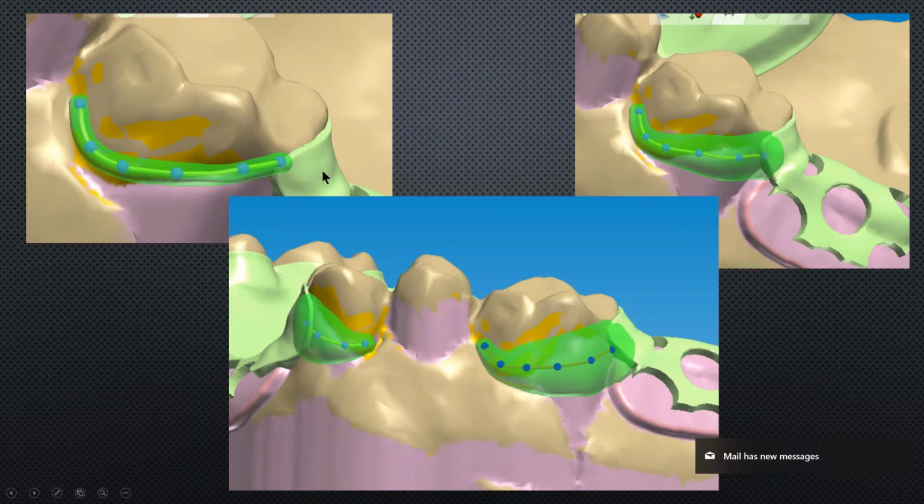What you see here is just choosing a generic clasp in the 3Shape, the options that they have already. And over here, I put what I would want for a Zerlux acetal type clasp. The Zerlux acetal clasp material has a little bit more stiffness to it, so you can be a little bit more traditionally designed over here. Then we jump to our VisiClear clasp. The reason I wanted to show this is you have your traditional metal clasp. We jump over here, acetal is going to be bigger, especially in the base area.